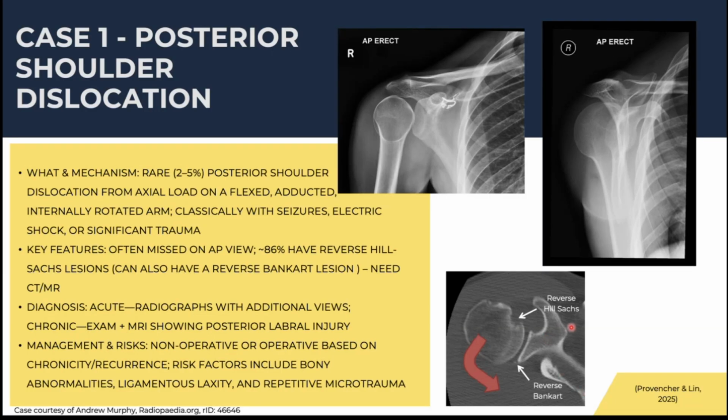Important to know that these defects can sometimes be difficult to visualize on the X-ray. The Bankarts you can usually see anteriorly at least, but with the posterior dislocation, you're going to struggle a lot. So the surgeons would normally do a CT for this.